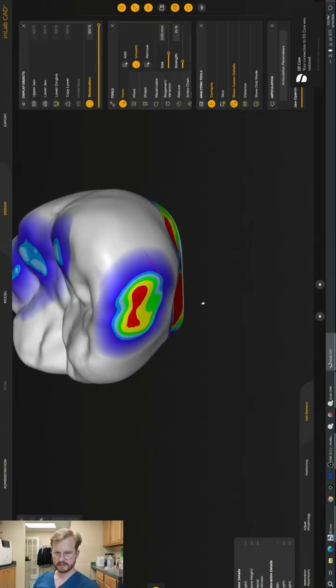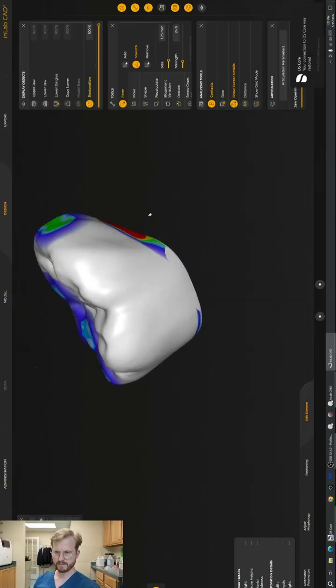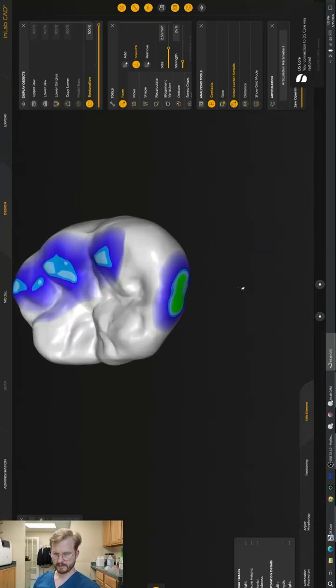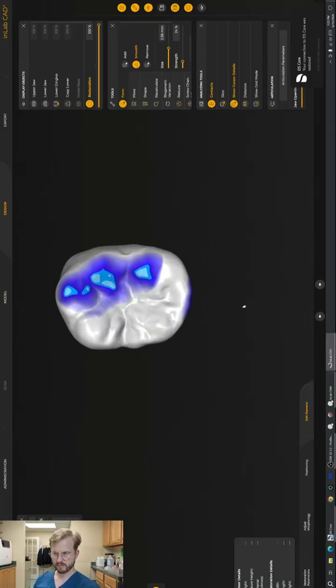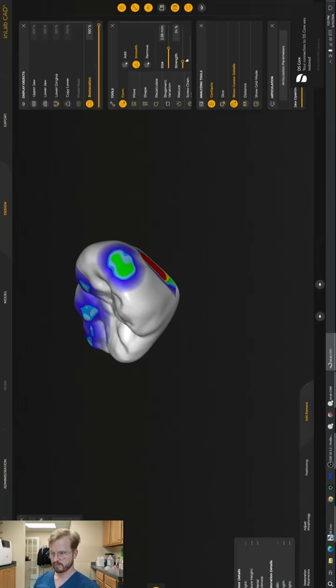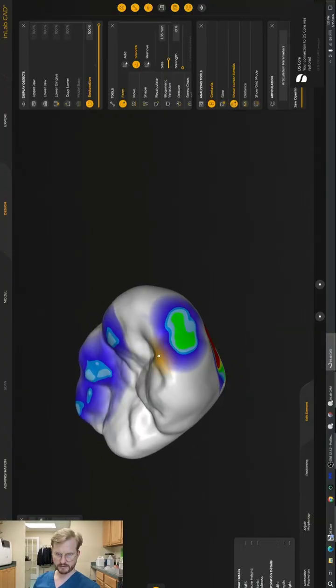Check our proximal contact. See, it's just a little over contoured after we increased that marginal ridge, so we'll smooth that back just a hair. Oh, I think that's looking pretty good. Decrease the strength slider there just a touch so we can come back through this marginal ridge and just make sure it's nice and rounded.